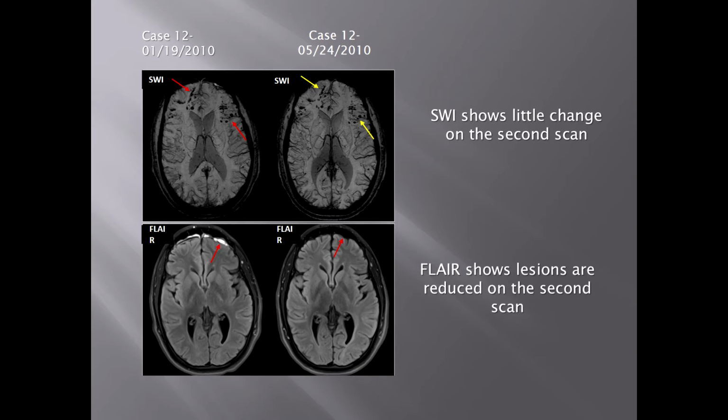Now, it's really quite amazing here. If you look at the lower images, the FLAIR images, they basically don't show any of this effect at all. Again, perhaps some blood here in the frontal area, but the SWI shows extensive damage in the white matter. And even though we don't have the perfusion information here, the odds are that this would represent perfusion deficit.